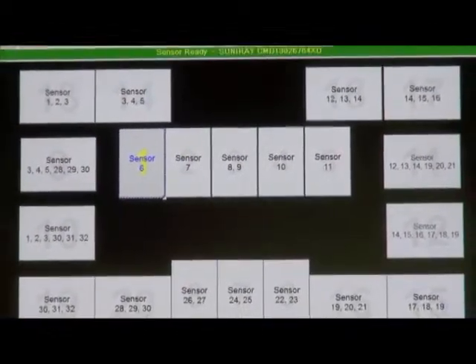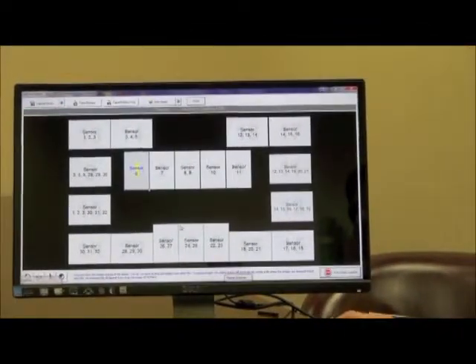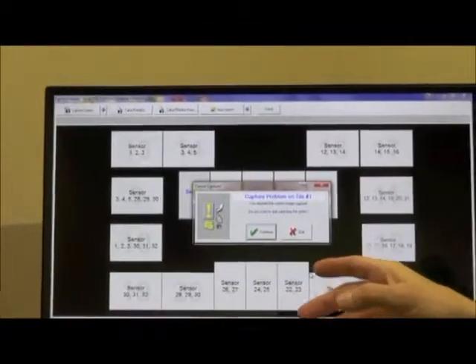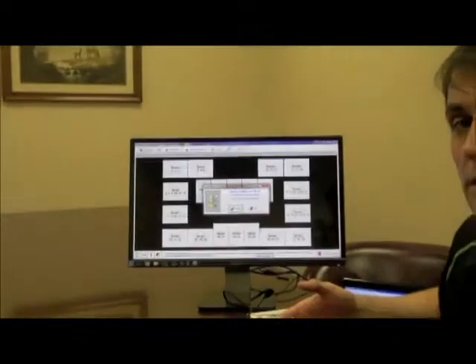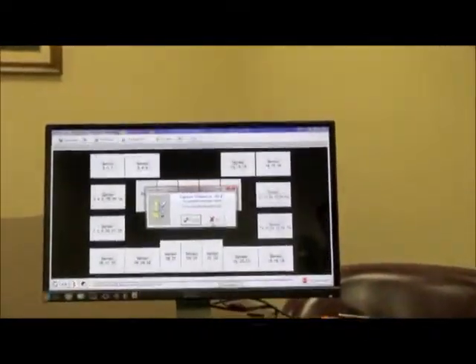So here we're going to stop the series capture. We're not going to capture any x-rays, so stop, abort. Now notice it says you aborted the current image. Do you want to quit capturing the series? If for whatever reason we didn't, we would click continue. If you do, you would simply click quit.